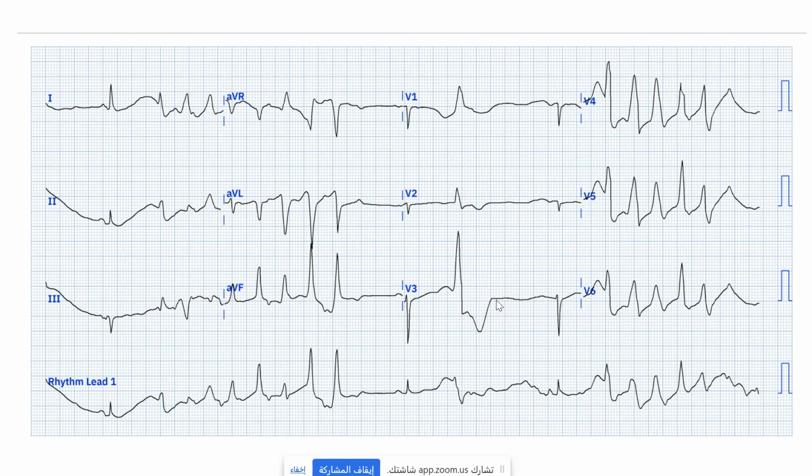Torsades de pointes. Yeah. Why? Prolonged QT. You can appreciate here if you look carefully. This is a sinus beat, and there is a PVC coming, R on T, because of the long QT. R on T, and then the patient went into polymorphic ventricular tachycardia. Excellent, good.